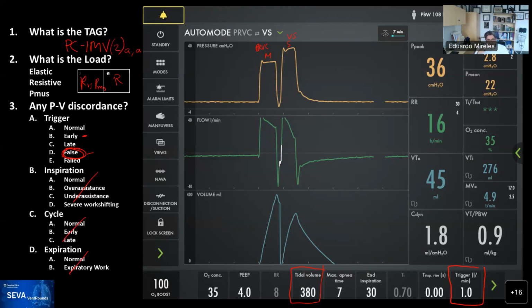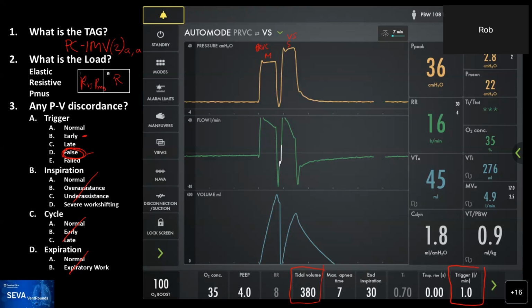Yeah, about how big the tidal volume was, it's hard to tell. I don't think you're going to get 400 or 500 every breath, because when the second breath comes in, because it's pressure control, the driving pressure is the airway pressure minus the pressure in the lungs, right? So the pressure in the lungs is still pretty high. You're not going to get the same size breath on the second one like you would if it was auto mode with volume control and volume support.